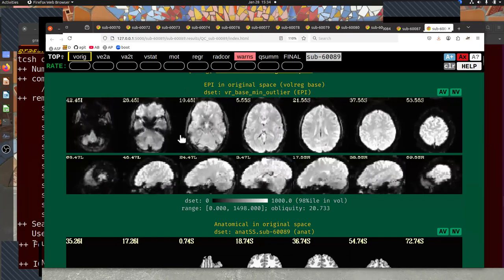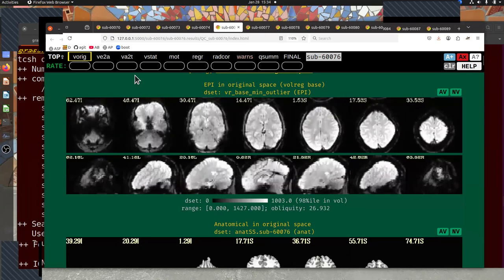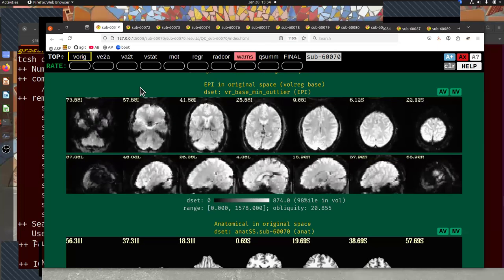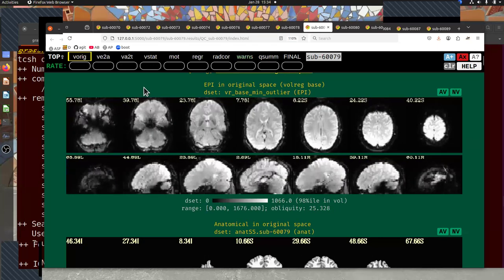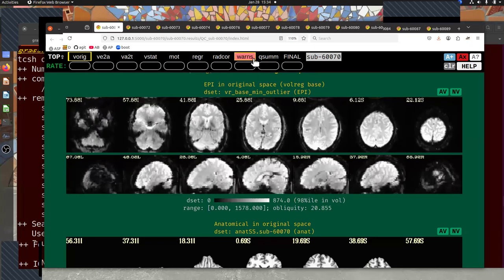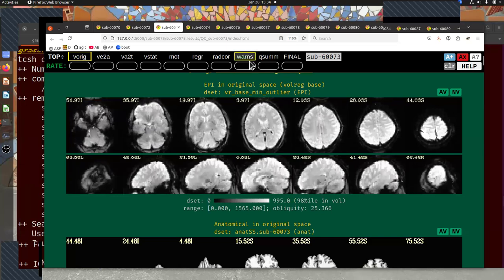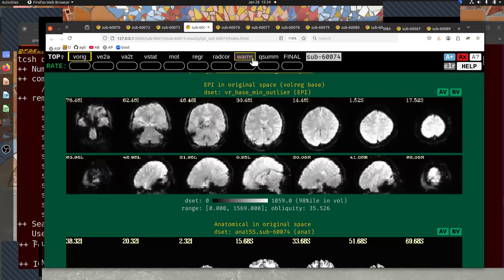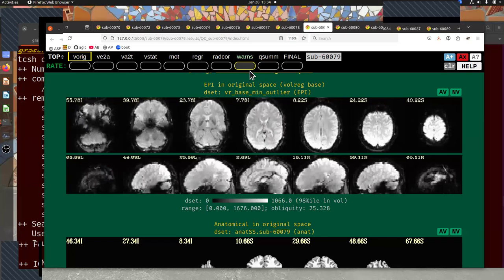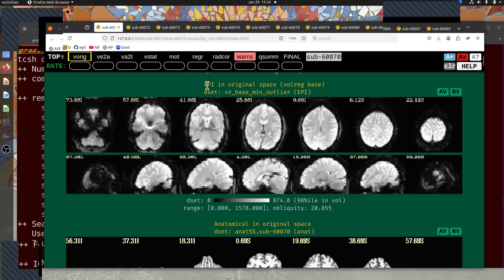So this image panel is kind of locked in here, and it's just the brains changing. I can go forward and backward with Control Tab and Control Shift Tab. You'll notice the warns level is changing. Different subjects have, I mentioned, different warns. This one has a maximum level of none. This one has a maximum of mild, medium, maybe a severe, and there's no severe here where it's bright red.